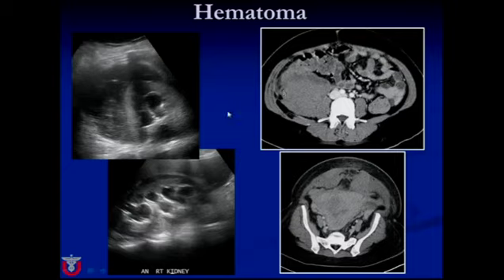This is another young lady who became acutely ill and developed DIC, which is disseminated intravascular coagulation. And this is actually in the right upper quadrant. This is her kidney, which you do see hydronephrosis. And in her, although this is quite marked, it was attributed to just the physiologic dilatation of pregnancy. But around the kidney, there is this mixed echogenicity collection with increased through transmission. Here is a longitudinal image. This is the kidney, head, feet. This is the liver. And you can see fluid in the perihepatic space or Morrison's pouch.